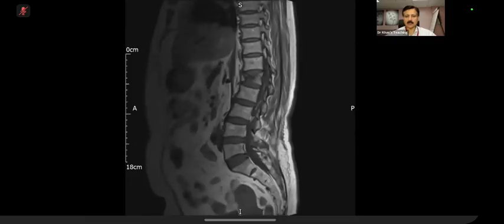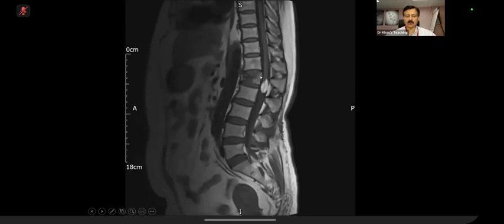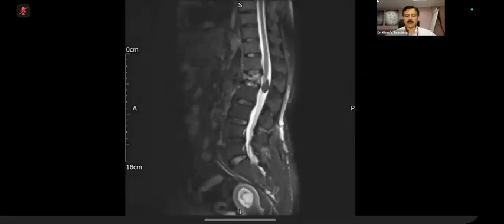Number two, is there a bulge on the posterior surface? If there is metastasis of something, there might be a bulge. Is the intervertebral disc next to it, has it got a biconvex appearance like this? So this is osteoporosis, and with this, a trivial trauma caused all this fracture. So this is an incidentaloma, lipoma, which we have covered. And we know that lipomas, on this STIR sequence and fat saturated sequence, just lose the signal. The last sequence which I showed you was a gradient echo T2.